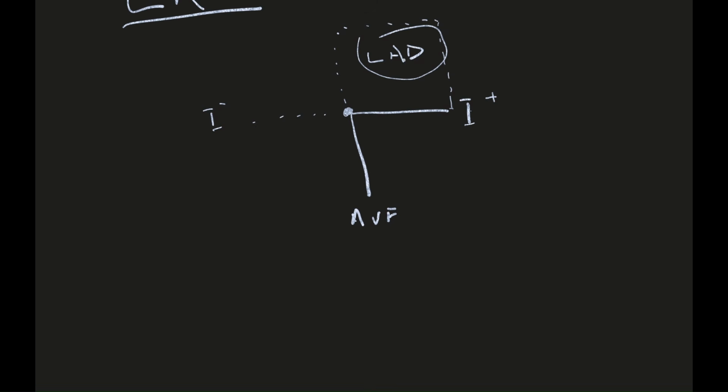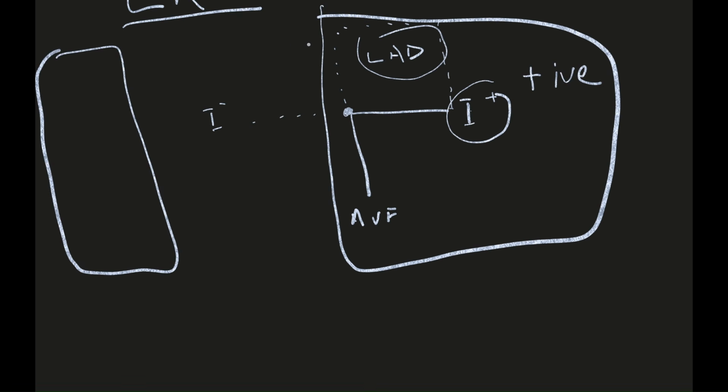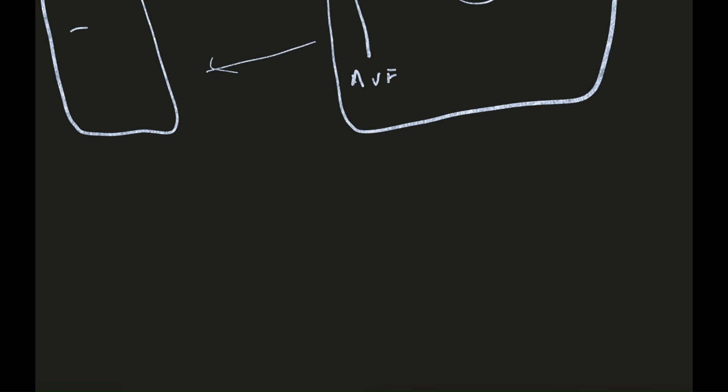So in left axis deviation region, your lead 1 is positive. This area of lead 1 is positive. This area of lead 1 is negative starting from this. Look, and let me draw it again for AVF.